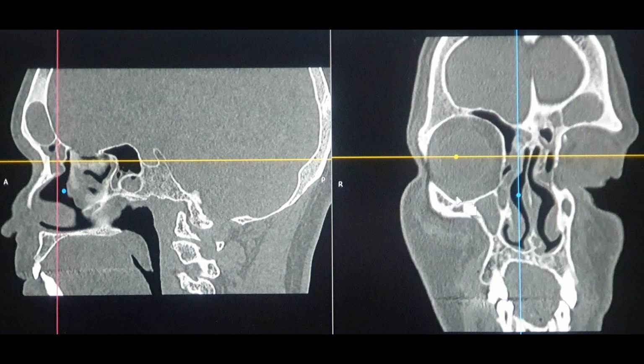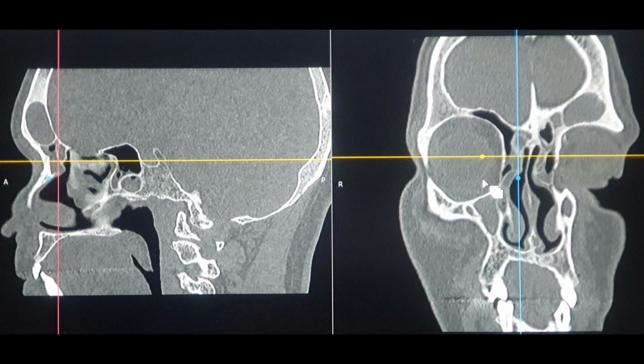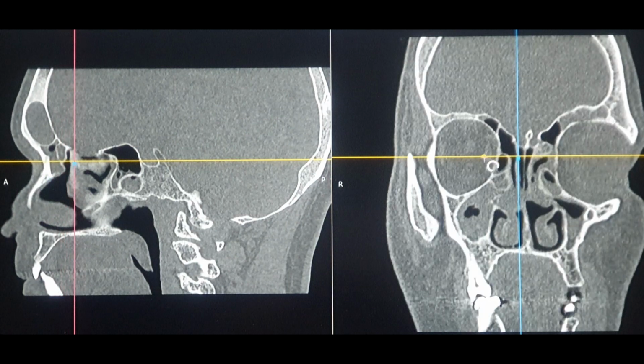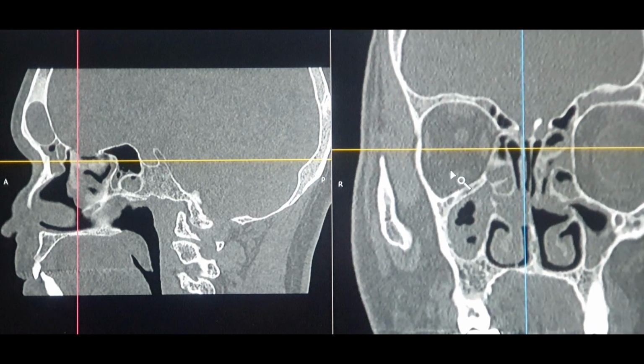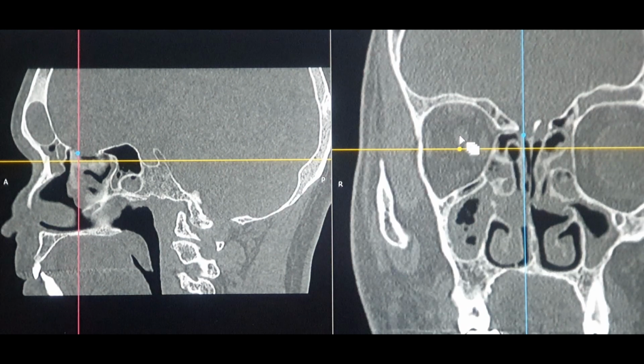artery. So if I'm coming from the most anterior aspect like this, and I keep going behind, and I start seeing the medial rectus and the superior oblique, slowly I'll start seeing a conical projection here. As you can see, if I zoom this for you guys, you can start seeing a conical projection over here. This is the actual canal in which the anterior ethmoidal artery runs from the orbit into the midline, and then gives a branch as the anterior falcine artery, and then it further goes into the nose anteriorly, and again it goes in the dorsum of the nose. Okay, so this is how the anatomy of the AEA stands.